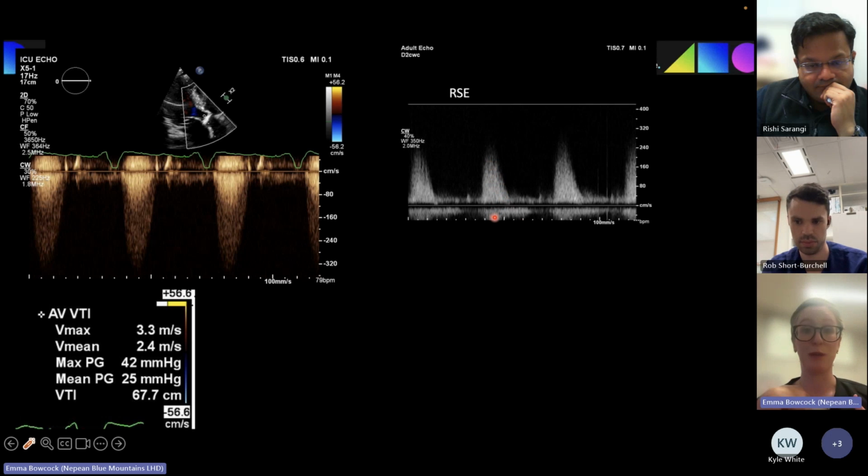So it's probably coming from sternal edge, supraclavicular, or suprasternal, right? If they give you this kind of profile without the little thumbnail at the top, coming above the baseline, just be aware of that because they will sort of show you that, I think.